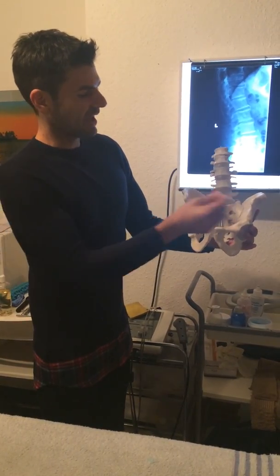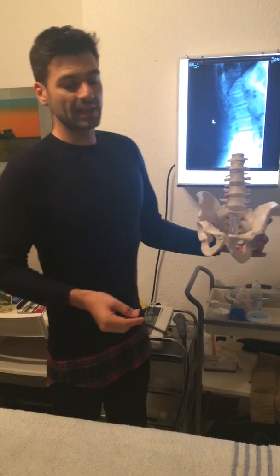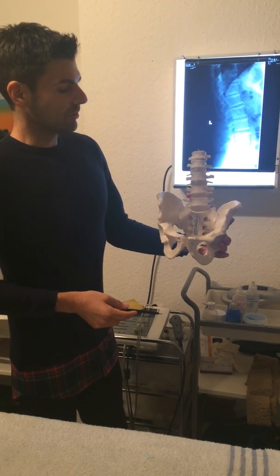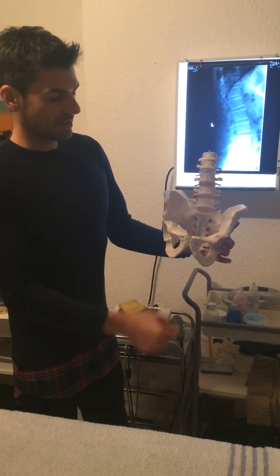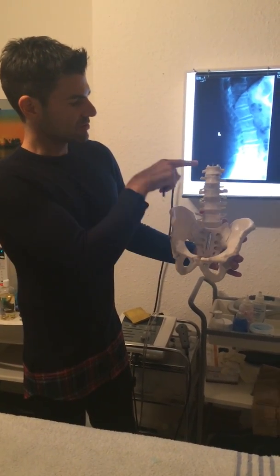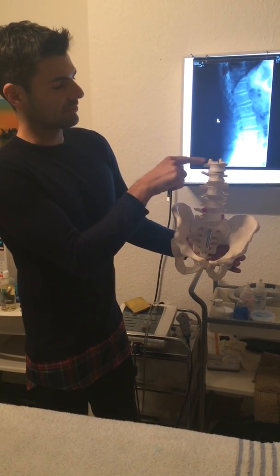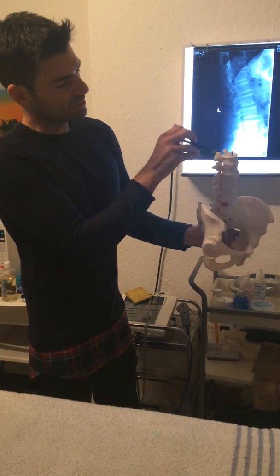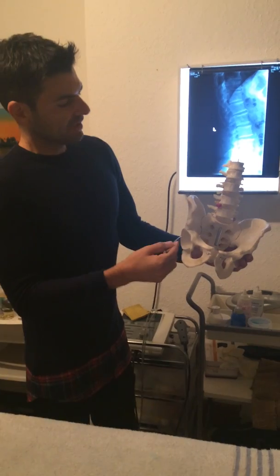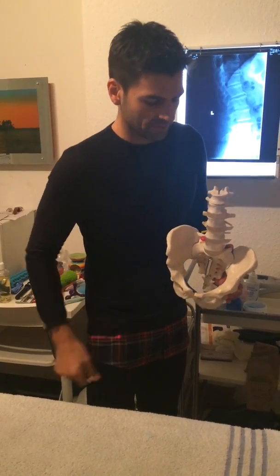Sometimes it can be if they're at this angle because of a leg length discrepancy, which is possibly a structural leg length discrepancy, which could be from birth, so one limb could be shorter, or it could be functional, where there could be a psoas muscle, so the muscle that goes from the transverse process area here of the lumbar vertebra 1 or the thoracic vertebra 12 through here and attaches to the top of the femoral area here. And if it's tight, it can cause shortening of the hip on that side.